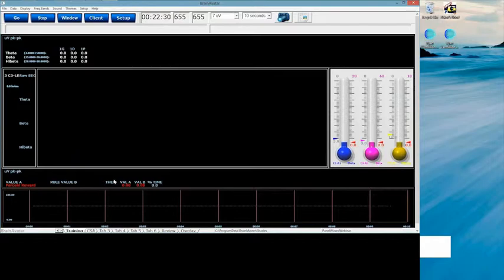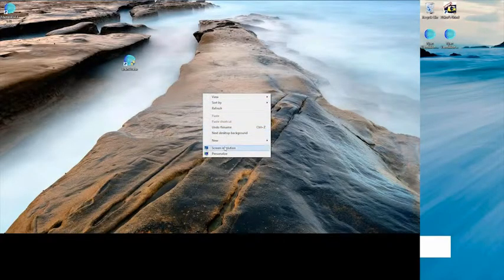Now, that's fine if you want to take a pre-built one and just run with whatever's pre-built on it. What if you want to do other things to it? What if there are things you want to monitor? What if there are other displays you want to look at? What if you wanted to do it through events versus regular amplitude training? Everything can be done, but first, before I do that, I'm going to change my resolution back.